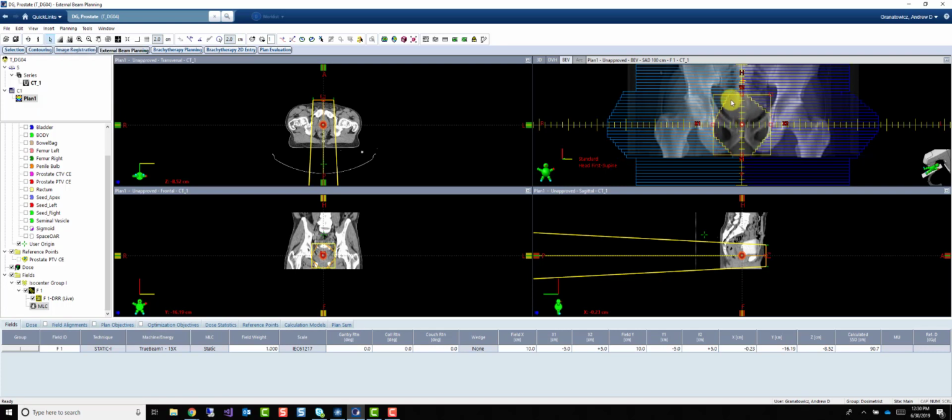If I wanted to change only, say, this X1 side over here, I would use this tool, select MLC Leaves, and then using your control key, you can select individual ones like this. Now, if you'll notice, only these green highlighted ones are going to move. So I can click, hold down the mouse, and drag them. And again, only those green ones that I selected are moving.